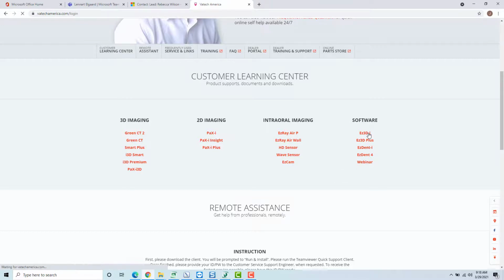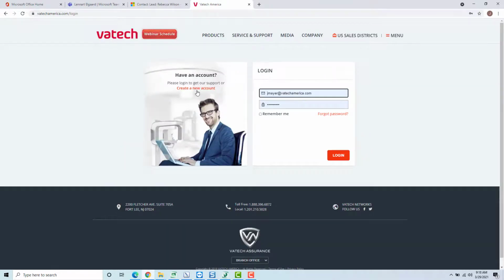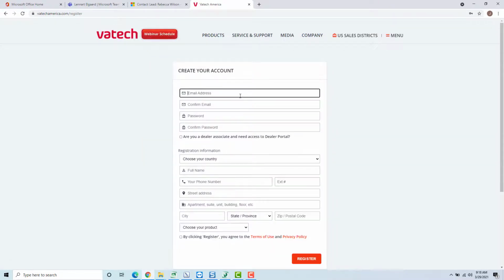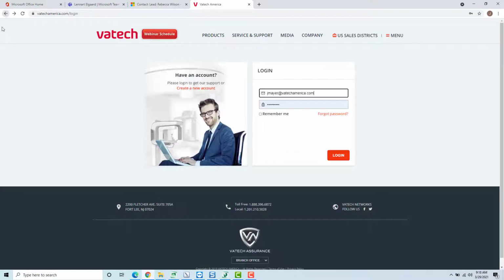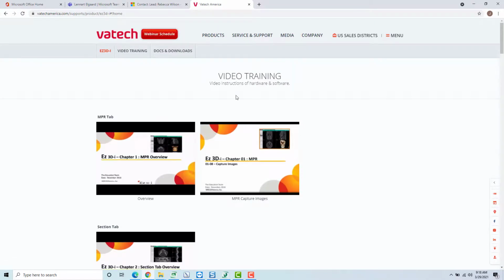To access these, I'm going to click on the subject. You will have to go in and create a new account. Go ahead and register your information and choose a product. In this case, I have already registered, so I'm going to click Login. This goes through our video training of our options.